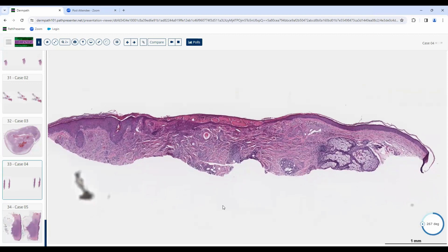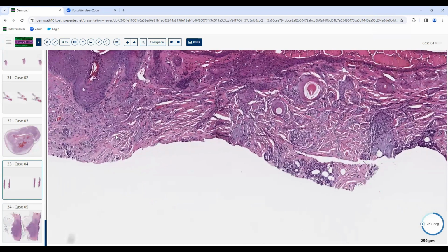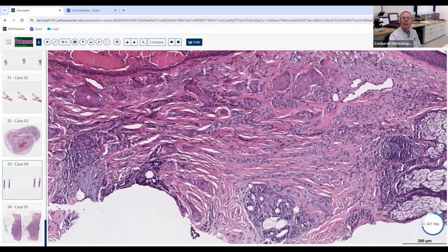Can you tell about the biologic behavior? I think I would go with malignant here. Yeah, we're compromised, aren't we? It's the tip of an iceberg, so we don't know. And why did you go with malignant, just out of curiosity? You're right, but why did you go with it?